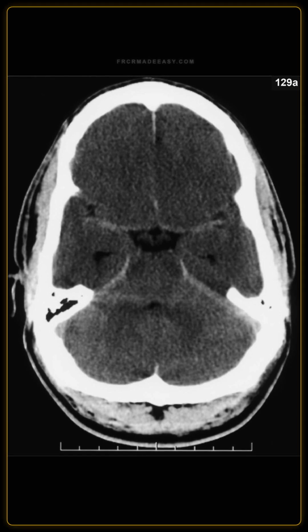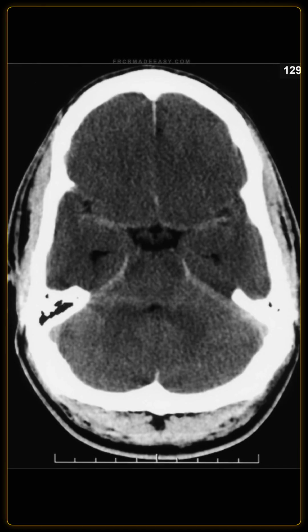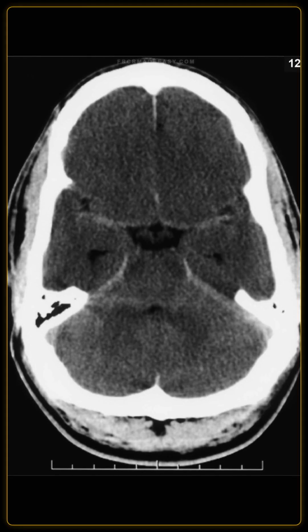A 36-year-old male was brought to A&E in cardiorespiratory arrest. No other history is available. I am showing you an axial non-contrast brain CT scan.